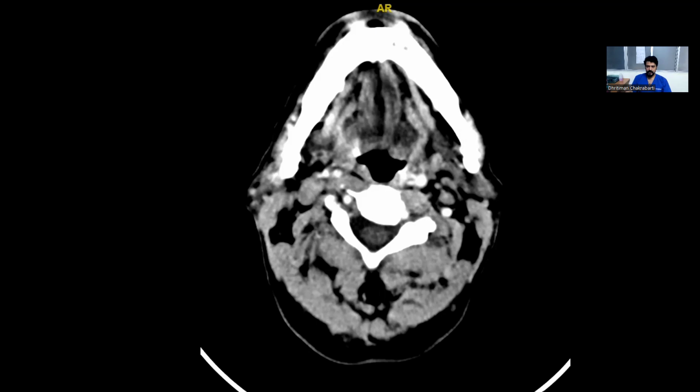But sometimes the radiology technicians, when they are in a hurry or pressed for time, do not correct for that and they take slices parallel to the ground. So you need to know how the slice was cut before you diagnose anything, because a lot of the morphology looks different when you are seeing it at a different slice angle. This one luckily has been taken at a correct slice angle, that is, it's parallel to the skull base. Mostly they will start at the bottom of the skull.